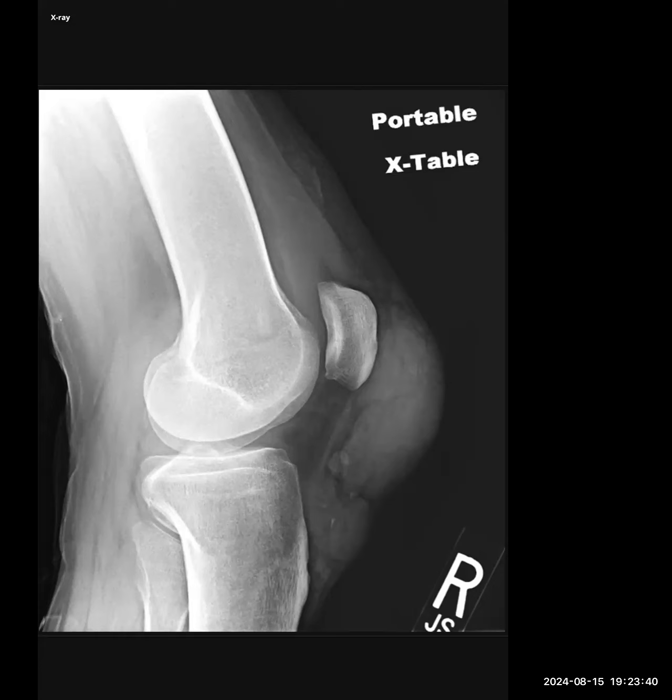So there is significant soft tissue swelling in the prepatellar region and joint effusion. I think this could be a prepatellar bursitis.